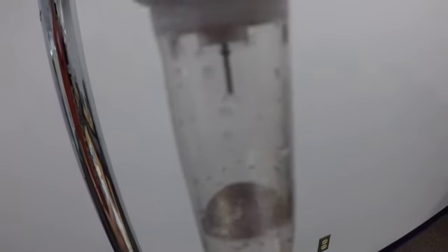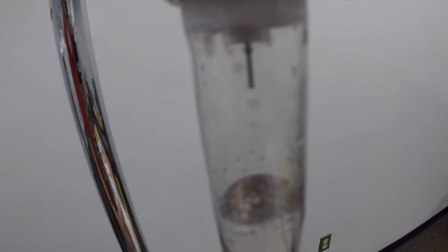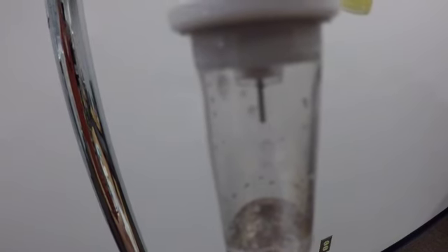Okay, well, let's say this dose isn't working. I'm not getting the blood pressure response that I'm looking for. So we're going to make it 2 drops per second on 1,000. Go the other way. Too much. 1,000, 2, 1,000.